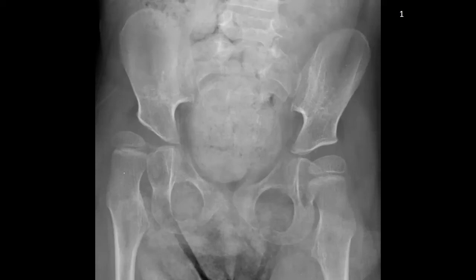And then now the X-ray is loaded onto HipScreen. Go ahead and go through the analysis, and you can write down the migration percentage that you thought. And once you do that, then you can resume this slideshow, and then we'll go through me doing it live through a video.